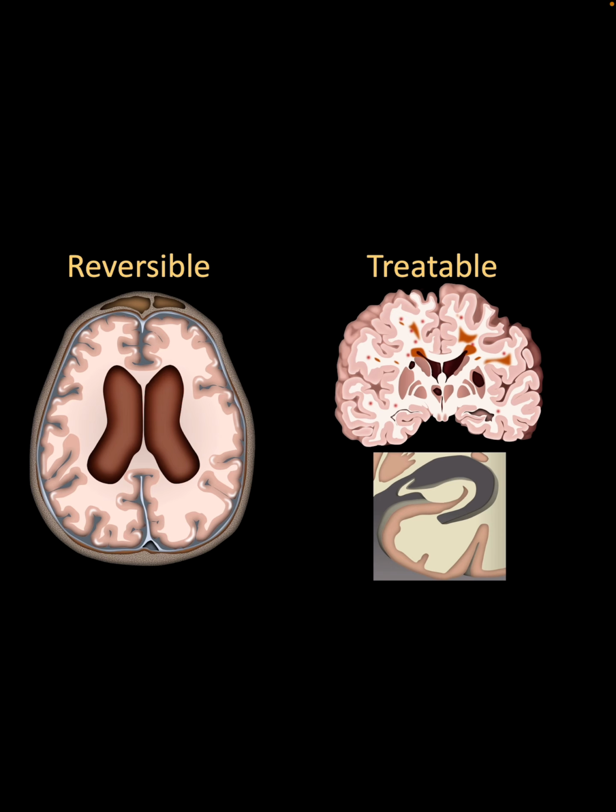So you should look for: are there findings of extensive vascular disease, signs of hypoperfusion, or strategic infarcts? And you should look for volume loss that's in a pattern suggestive of Alzheimer's disease, specifically looking at the hippocampus and entorhinal cortex. If you approach imaging for memory loss in this way, you'll never forget an important finding.